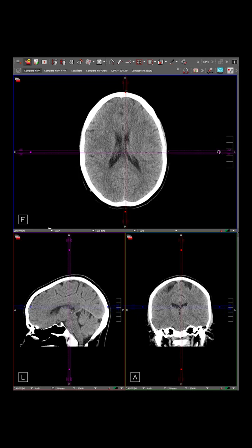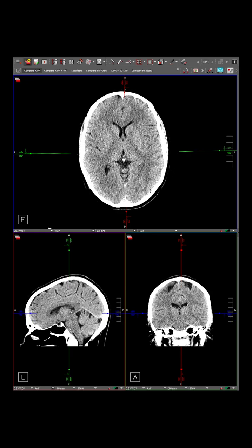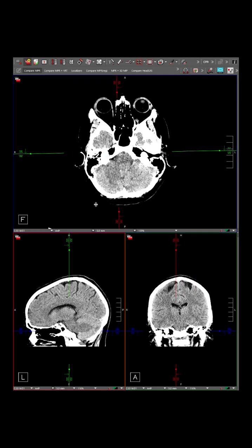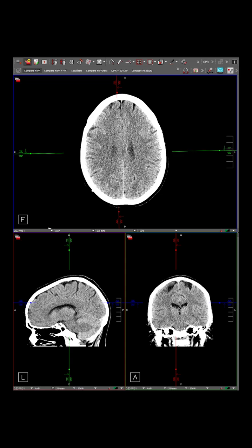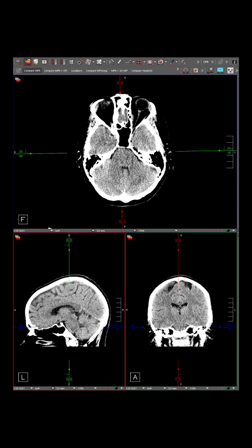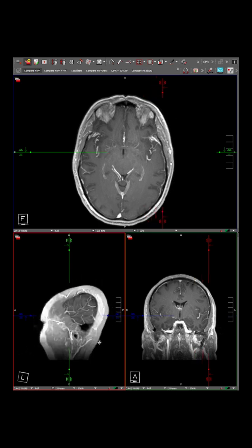Now, that's clicking with the left mouse key to get that smooth scrolling, but you can also do book-ended scrolling, by scrolling with the middle mouse key. You can use a combination of those to slow down when you'd like, or do a more conventional search, the search that is more typical when you've got the book-ended images. Now, by the way, back to our MRI. This is a scenario where smooth scrolling to look for subtle enhancing lesions is going to be very helpful.